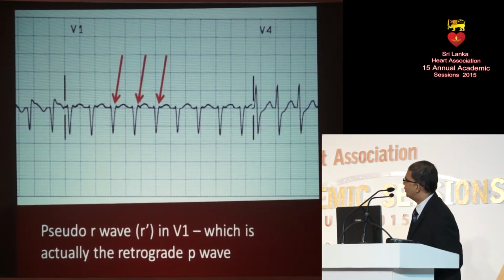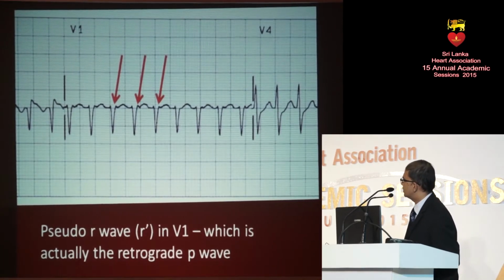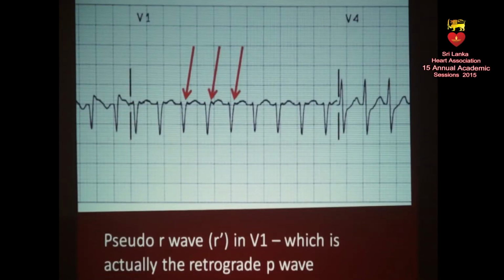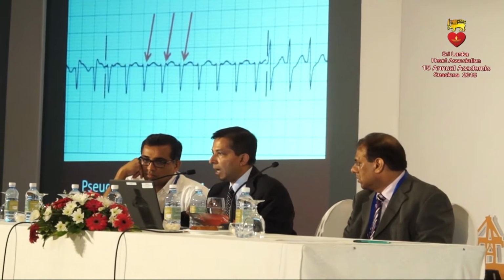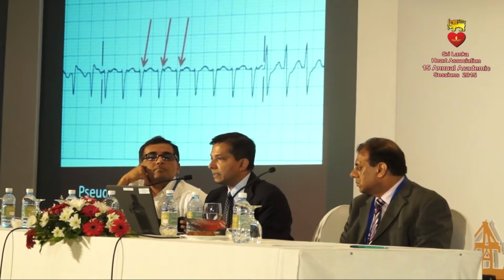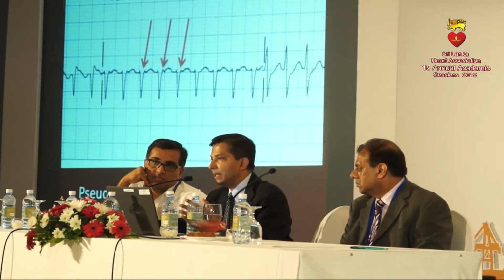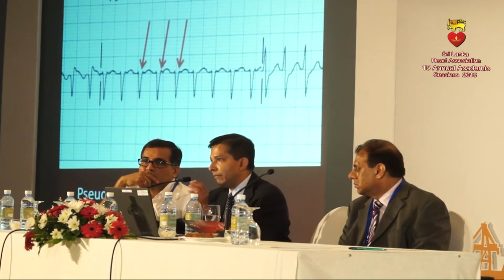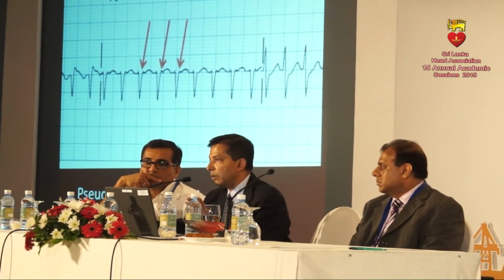Any comments from the audience, from the expert panel on this? It's a very simple case, so I don't know if there's anything much to comment. Yeah, I totally agree on that. The diagnosis. Just to add on, like yesterday, we talked about the AVR being the neglected lead. So even here now, after Dr. Gunawardena's explanation, there is a pseudo R prime. It's not a true R prime. To be called R prime, it should be part of the QRS complex. So you have R wave, then you have S wave, then you have a small R prime. But this is a pseudo because it's a P wave that's reflected upon the R wave. So it's a pseudo R prime.